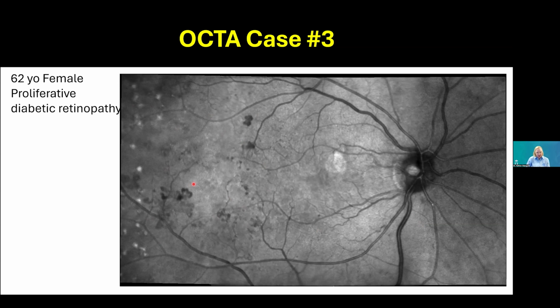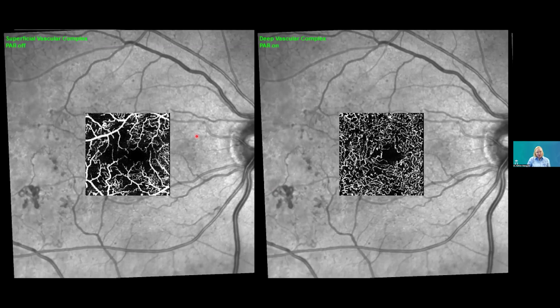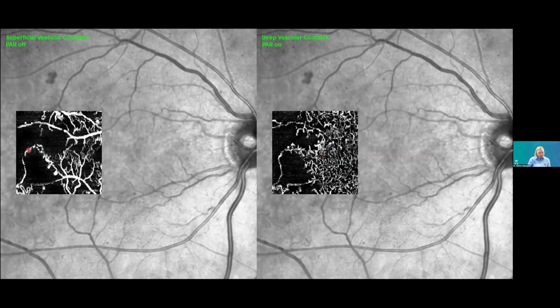When you're looking at this patient's fundus, of course, there's a lot of non-perfusion here, but OCTA can still be helpful, right? When we look at this area over the fovea in the deep vascular complex, there's a lot of non-perfusion and remodeling of the foveolar avascular zone. But we can also start to look at this junction between perfused and non-perfused retina. Now, she clearly has some little neovascularization fronds, but in somebody like this that is so far advanced, sometimes I like to see where that true border is so I know exactly where to look for very subtle neovascularization because it's encroaching on the posterior pole.